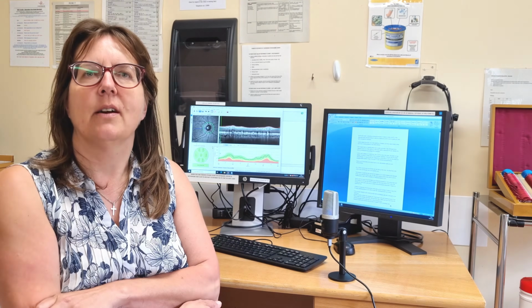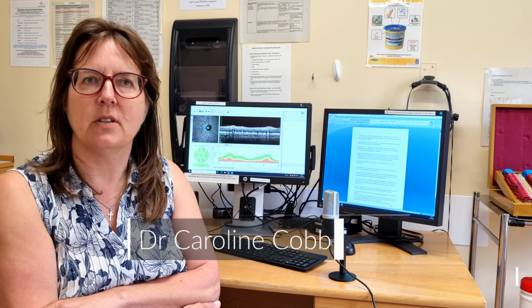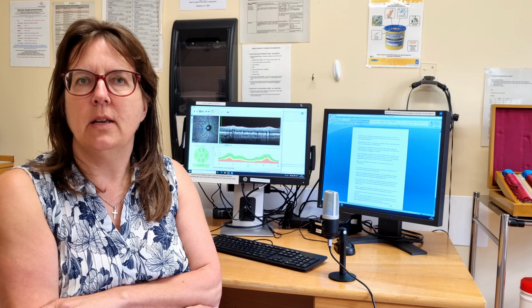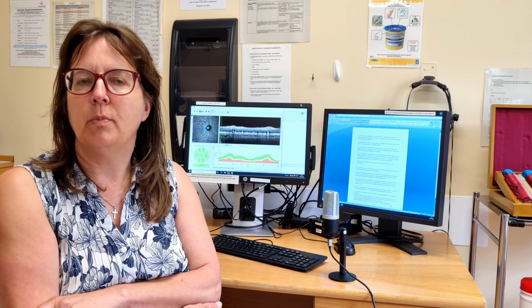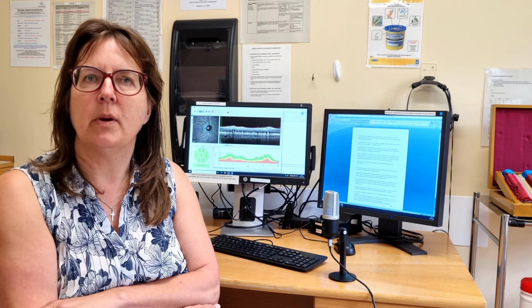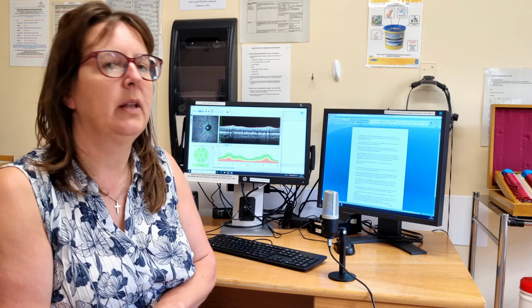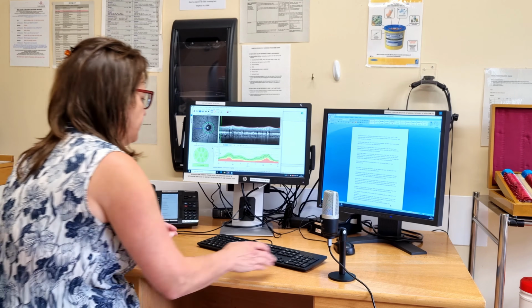In this short video, I'm going to talk you through the basics of when to order an OCT in the glaucoma clinic and how to use the OCT to influence your management decisions in a useful way. I always do an OCT as a baseline on a patient, and then I would repeat it every year unless you have a patient who is very young or has a very high pressure. So I'm going to start off by looking at a normal scan.